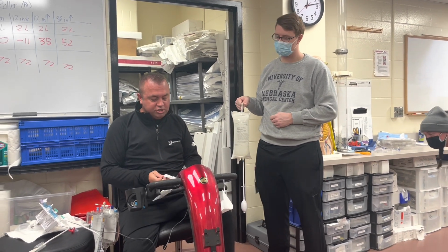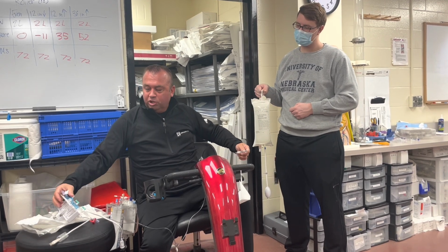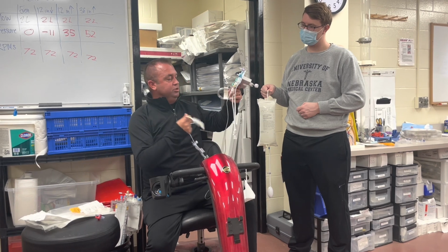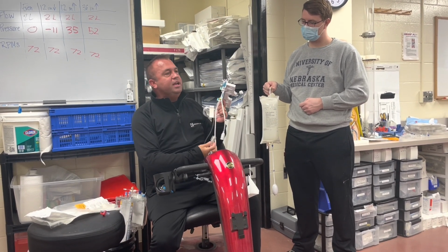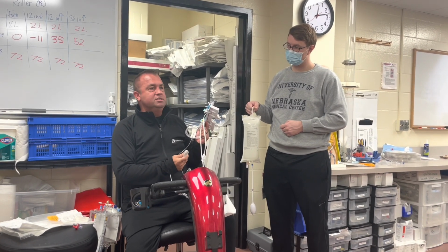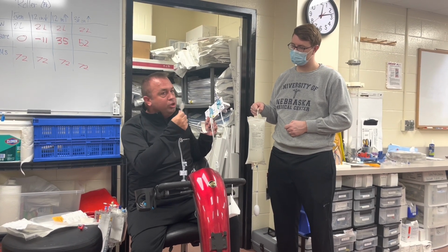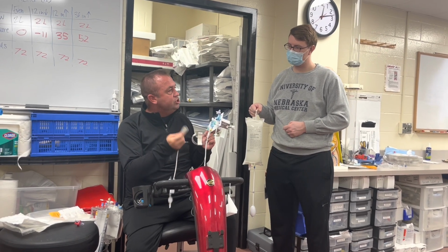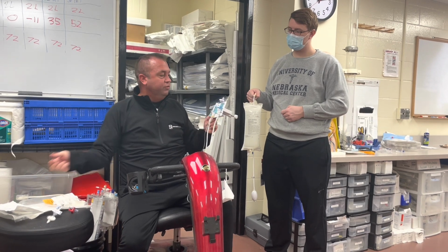So these transducers are all different. They all have different plug-ins for pressure. For instance, when you see these two different ones, you'll notice that they're completely different plugs. Why would they have different plugs? Because not everyone has the same monitoring system, right? So you have to order the transducers that match the plug-in to the monitoring system you have, or the heart and lung pressure cables that you have that connect to your heart and lung machine for perfusion.